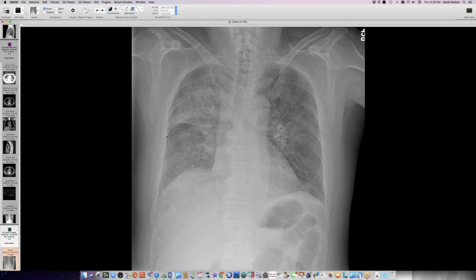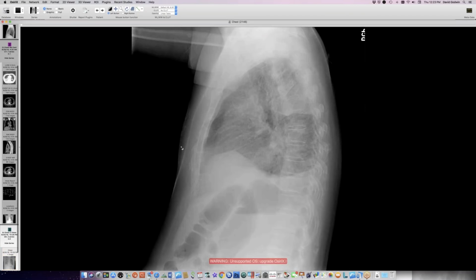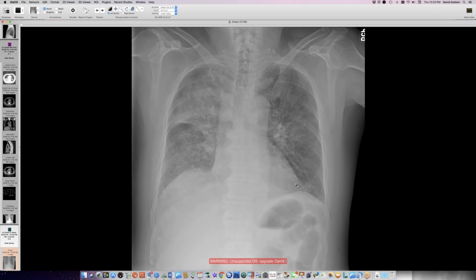And he has this diffuse lung disease. By this time, he was having difficulty breathing. He was short of breath. He had a really bad headache, and had this set of radiographs, including some pleural effusion. I don't know how much hydration he'd been given at this point. And he was hyponatremic on their initial lab workup. I don't know what his white count was.